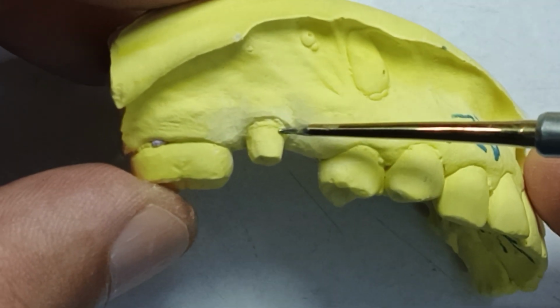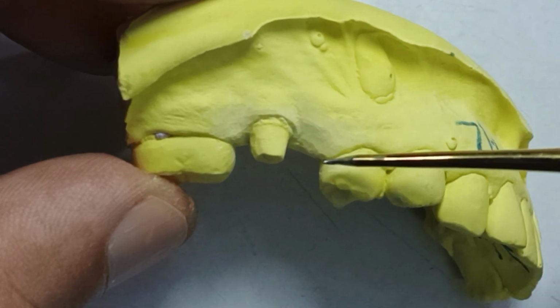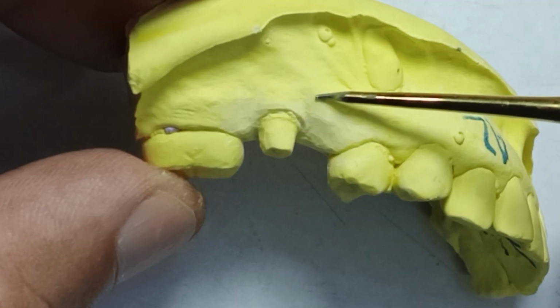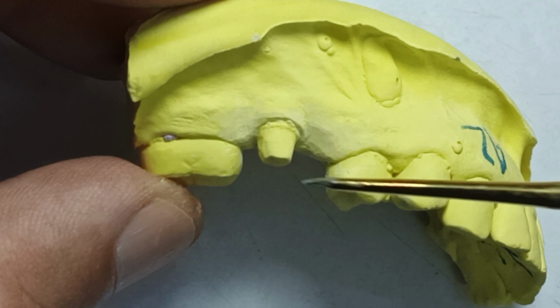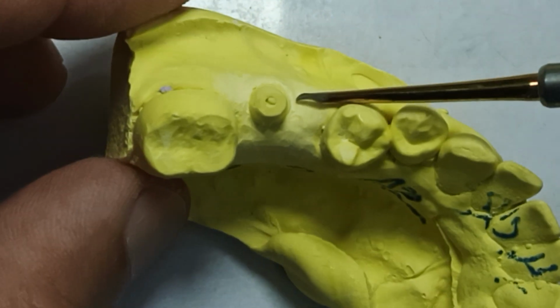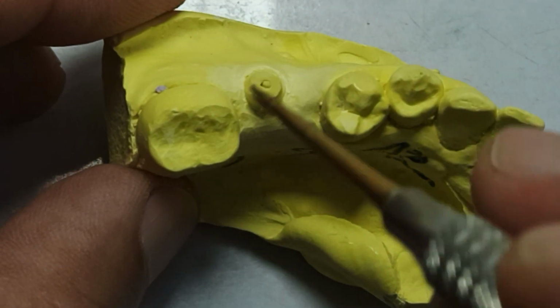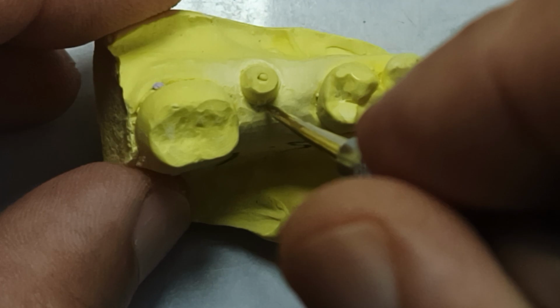Now look at this implant. They should have sent an abutment, but before that the implant is placed wrong. It should have been right down the middle. Imagine they cannot bisect this simple space right here. And now you look at the occlusion. Where is the implant at? It's totally outside the envelope. Where is the crown going to be? Couldn't they place it right down the middle when they're placing it, like in this angle?